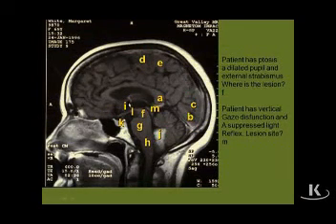Letter I is simply the area in the third ventricle, probably in the area of the hypothalamus. Letter K is an area of the brain encased in bone. This is the area where we'd find the anterior and posterior pituitary and the sella turcica. Letter I represents the area of the third ventricle, and in its lateral wall would be the hypothalamus.